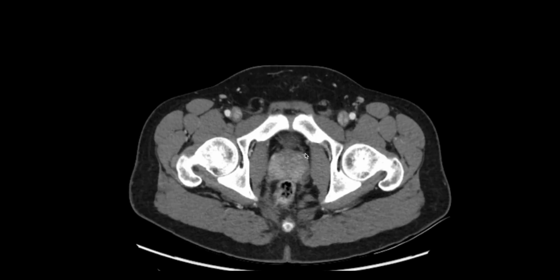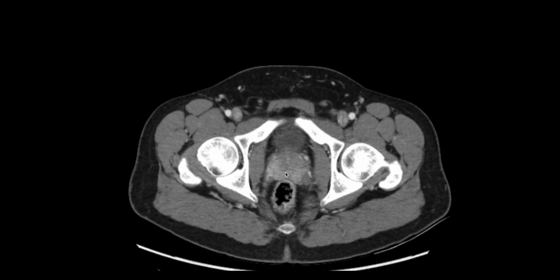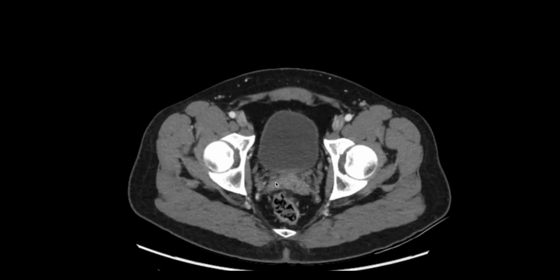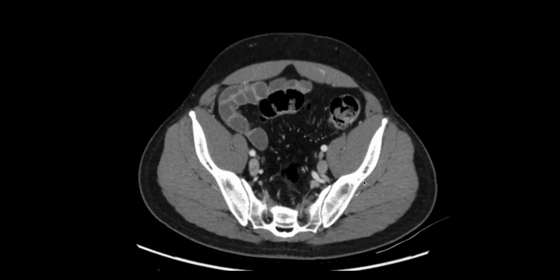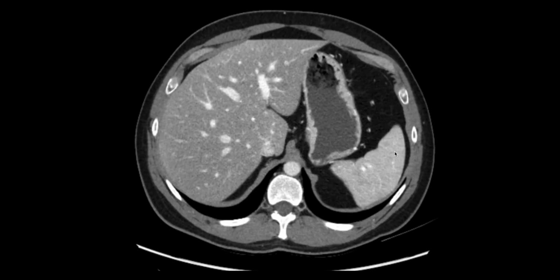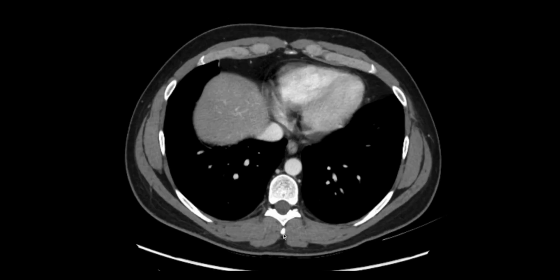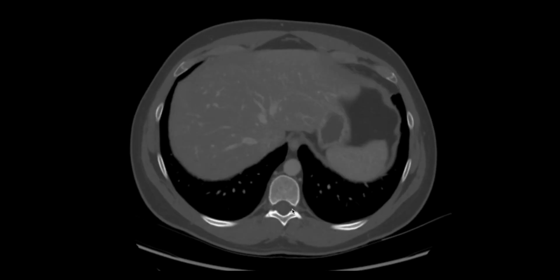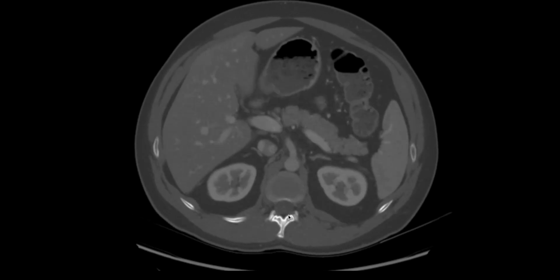Finally, in this male patient, we can look at reproductive organs, although CT is generally quite limited for this evaluation, where we see the prostate and seminal vesicles, and we can look at the patient's body wall and musculoskeletal structures on standard windows for any asymmetry or abnormality, and then switching to a bone window, we can scroll through slowly and look at the bones for any areas of cortical abnormality.